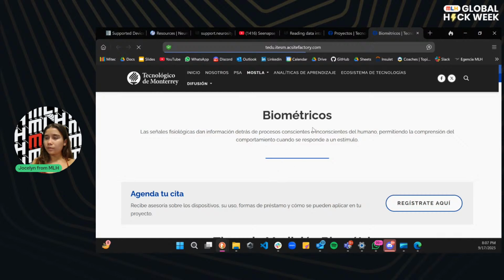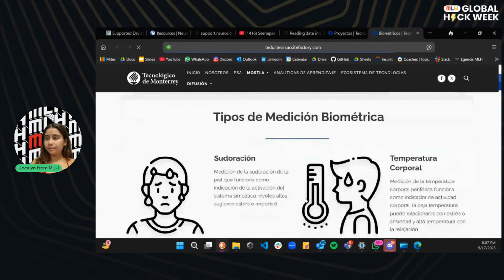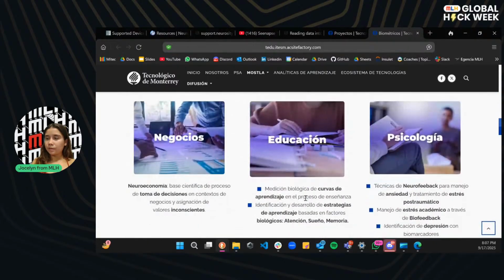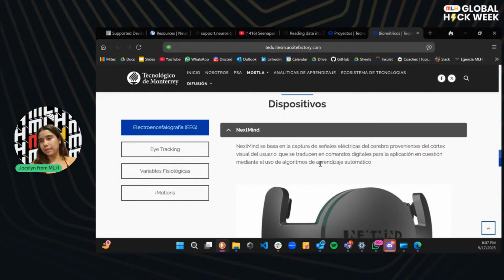I think it's loading for a while. Oh, this is taking a long time. Oh, there we go. So here are the devices.